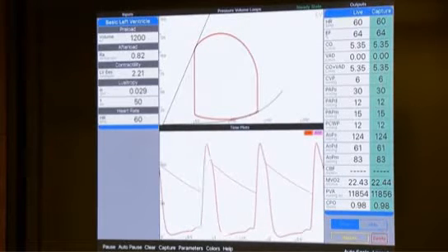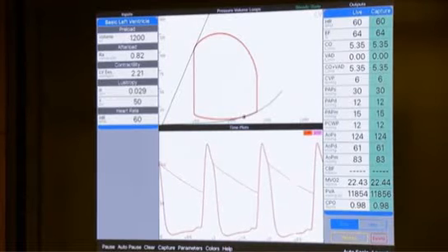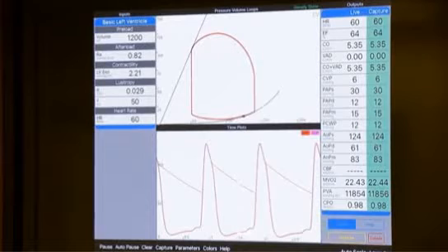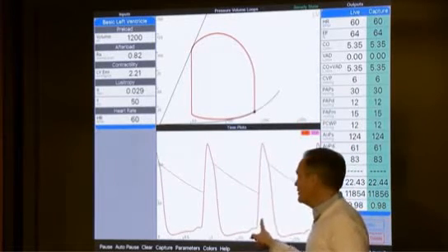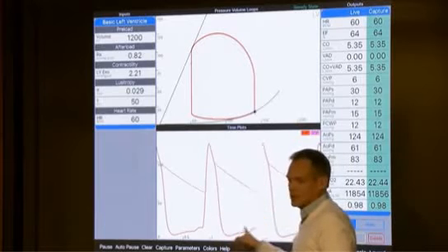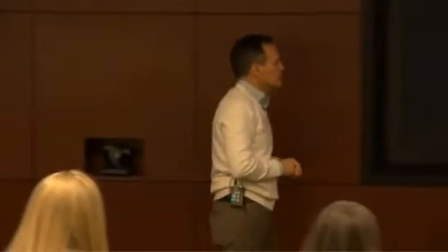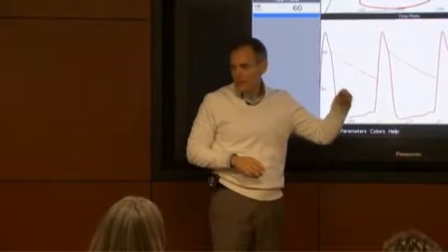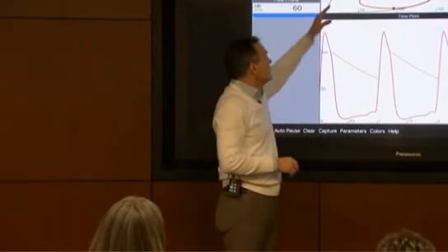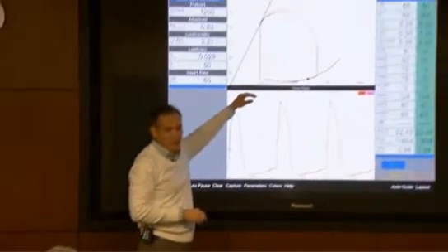And then in the center, of course, is all the graphics, which should look a lot like that first couple of slides that I put up. You see the pressure traces here, aortic and ventricular. And then above, the corresponding pressure volume loop, and you see the bouncing ball going around. Each goes around once each heartbeat. The end systolic pressure volume boundary and the end diastolic.